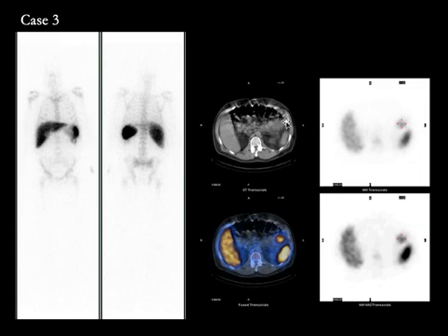The CT that was acquired as a part of the SPECT CT was non-contrast enhanced. You can see there is no contrast in the aorta or the IVC. There is no enhancement of solid organs. So we cannot evaluate this focus better on this CT, but this patient had a contrast enhanced CT of the abdomen and pelvis, which showed an abscess formation in the left upper quadrant secondary to diverticulitis.